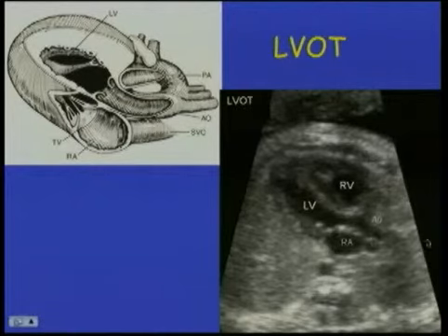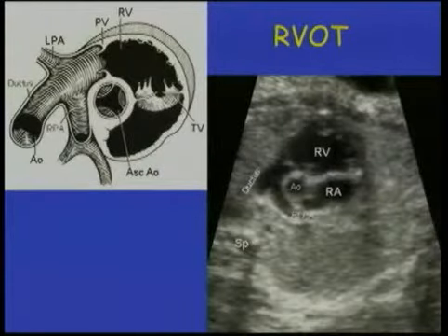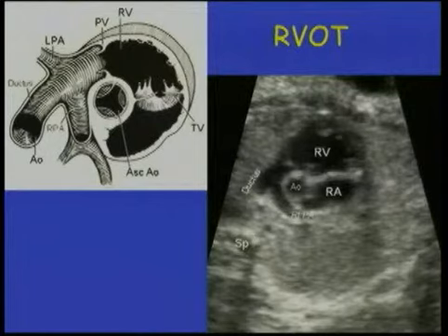That's from the aorta, sweeping along here, and that's very important to look for VSDs as well as malalignment, because if the aorta goes over into both ventricles, then we worry about transposition of the great vessels, truncus, or tetralogy, double outlet right ventricle. This is a picture of the right ventricular outflow tract.